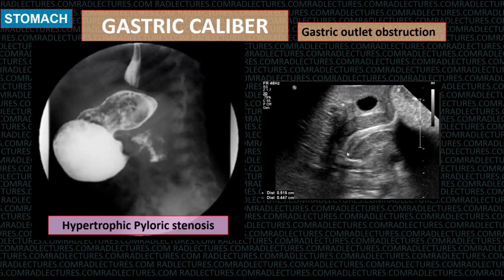Now here I bring your attention back to what I was saying when we were talking about anatomy. It's important to recognize that the pylorus of the stomach lies very close to the gallbladder, and here it is the gallbladder. Any image that you see, you'll find that the gallbladder is very close to the pylorus.